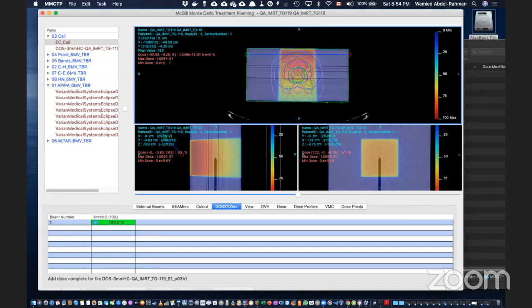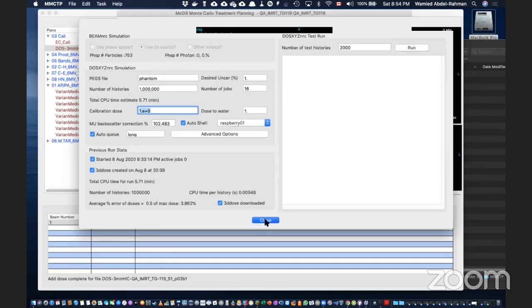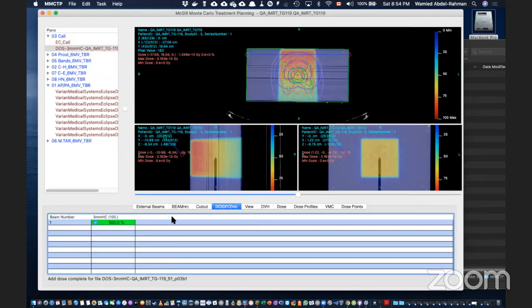It's just from the maximum dose, and for Monte Carlo, see, it's a different scale. So this is what I need to change, and that is done from here. This is the calibration dose. I'm struggling with this. I try to put the numbers, and then things don't make sense. So I'm working on that, so that at least then I get agreement.